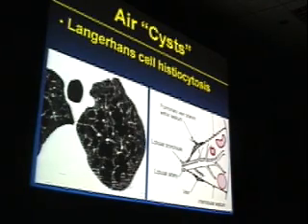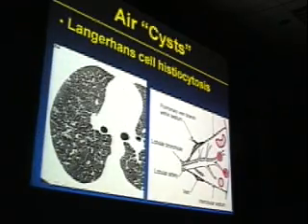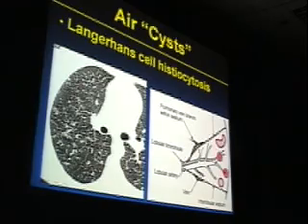The vast majority of these patients are smokers, and this is considered a smoking-related lung disease. Here's another patient with LCH. In this case, we see smaller cavitary nodules. We see some scattered centrilobular nodules, and some other areas of less well-formed cystic change within the lung. It is the finding of nodules and clear-cut air-filled cysts which allows us to make with high confidence a diagnosis of Langerhans cell histiocytosis on CT.